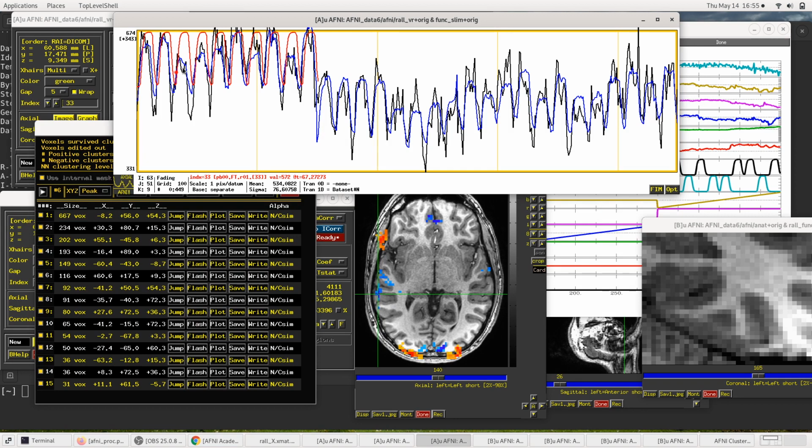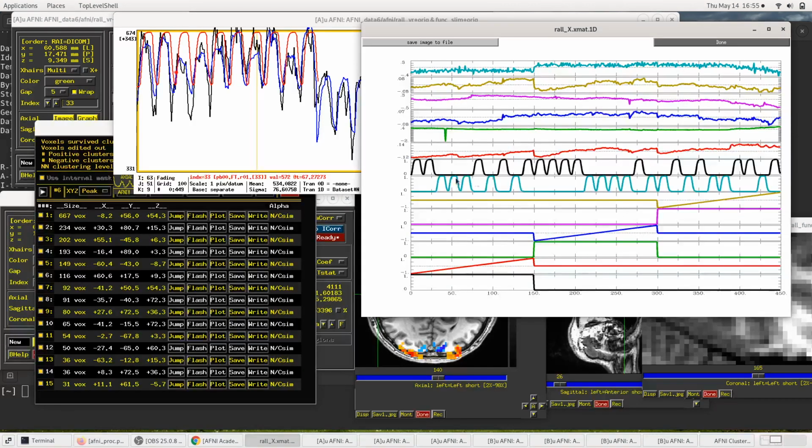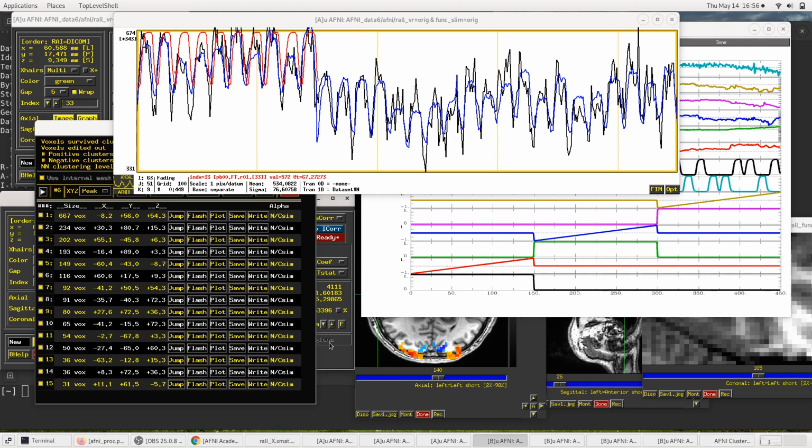And then after the first two auditory reliable stimuli, you have three visual reliable stimuli. You can see in the X matrix here. So you notice that the audio responses are big, big, and then shorter, shorter, shorter, and then a bigger response, and then a shorter response, and then a bigger, and then a shorter. You're seeing a voxel where the beta weight for the audio reliable condition is larger than the beta weight for the visual reliable response. And so this current voxel has a large contrast value.